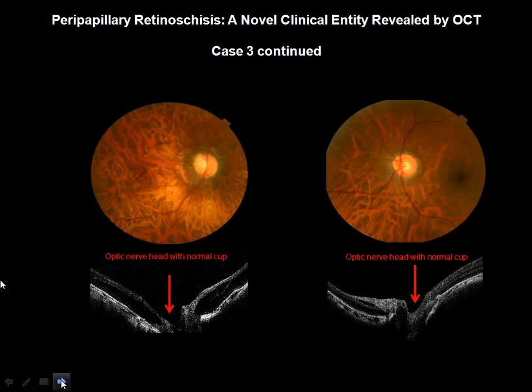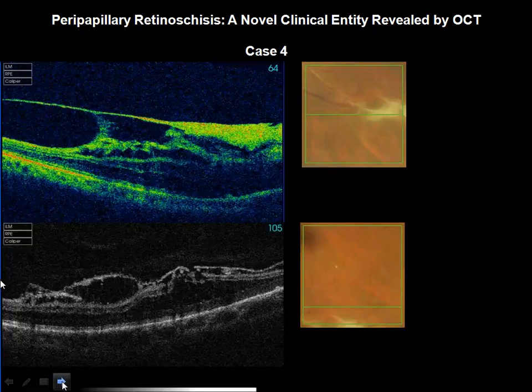And if you see a schisis, what you should do is search for traction. And if there's any traction, and if the patient does progress a little bit over time, I would see these patients very often, probably every couple of months, then you might want to consider doing a vitrectomy and a membrane peel. I don't think anyone's published it. I don't think there's anything in the world's literature on that.